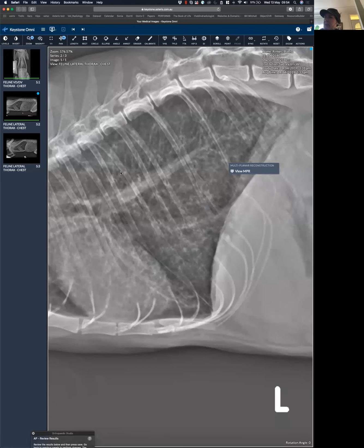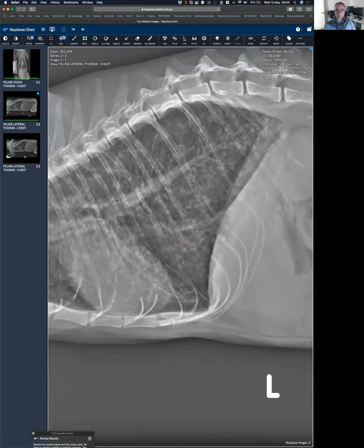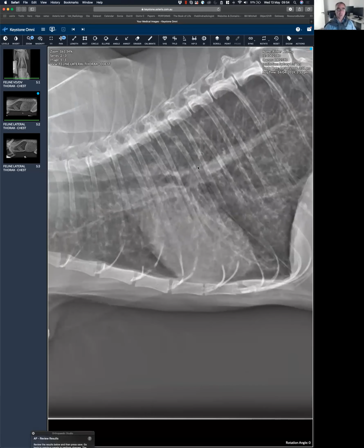And does it need to involve more than one lung lobe? No, it may be a situation where, I'm thinking, if there's a foreign body in the airway and now it stays within one lobe, that's going to be uncommon, but that would be a situation where you have a bronchial pattern in one lobe. So the distribution doesn't make the pattern. Okay, yeah, cool.